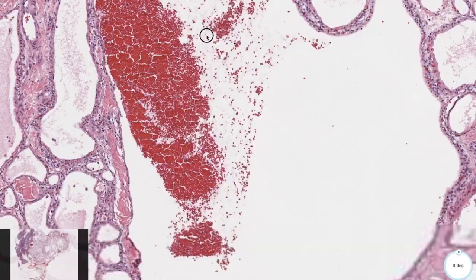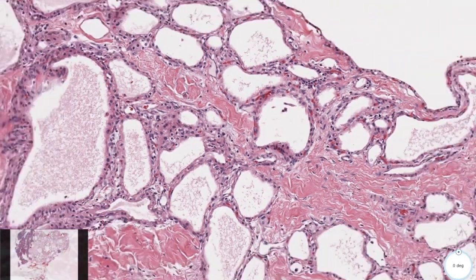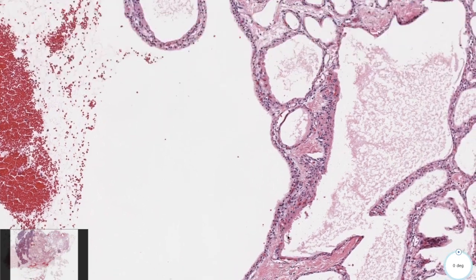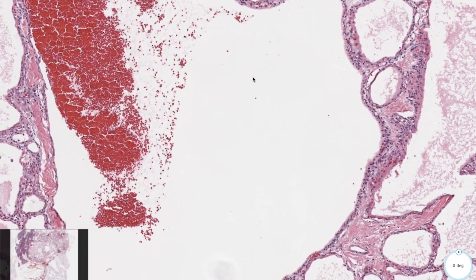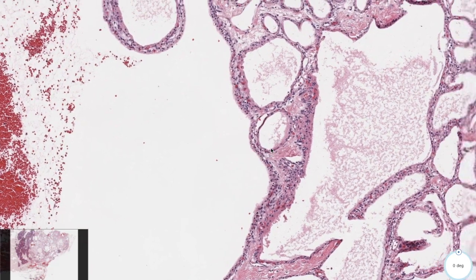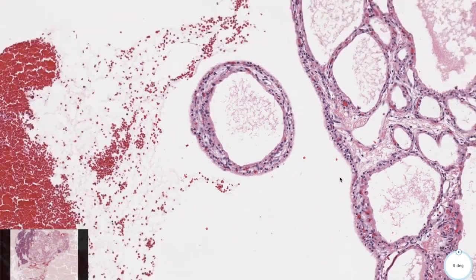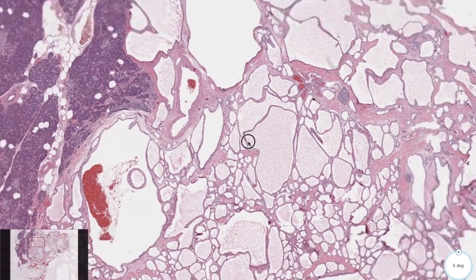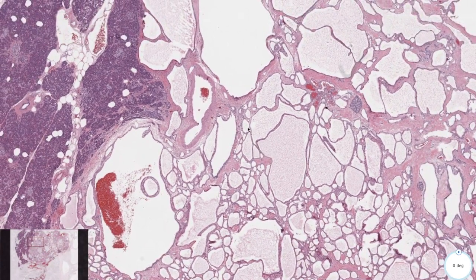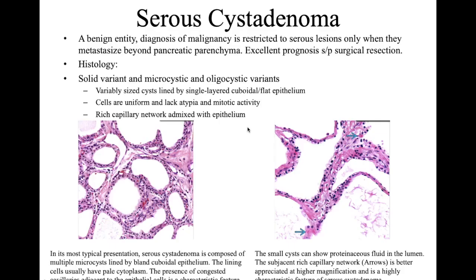So right away we're looking at a cystic lesion with relatively benign features. If we were to categorize this, we'd be in a neoplastic category, then we'll go into the benign category, and this is likely something that's a low-grade lesion. So this could be, I think it's a mucinous lesion. Let's take a look exactly what this could be. So path presenter case 5. Oh, I'm sorry, it's a serous lesion. I was thinking of something else.